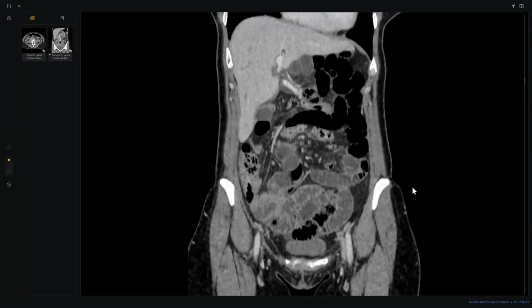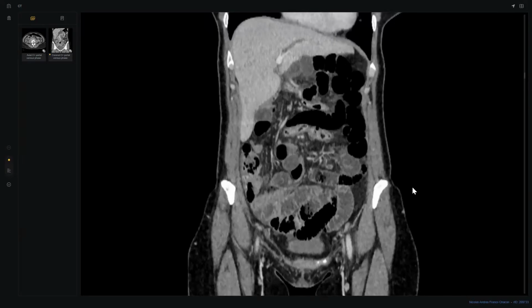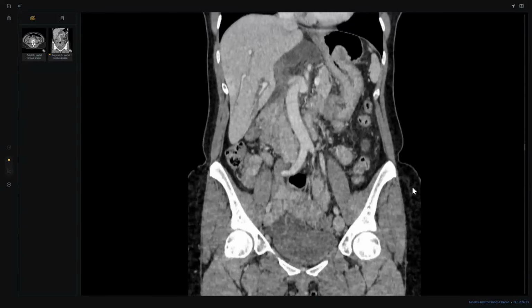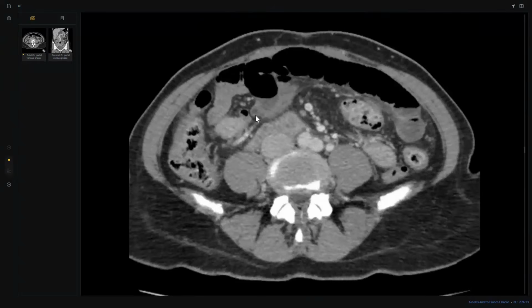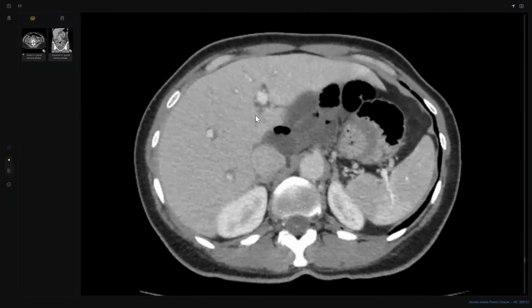What's your final diagnosis? I'm suspecting internal hernia, paraduodenal internal hernia with ischemic bowel. What is the exact name of this type of hernia? Right paraduodenal hernia. Check the axial again. It has a more specific name. Where exactly is the bowel located?